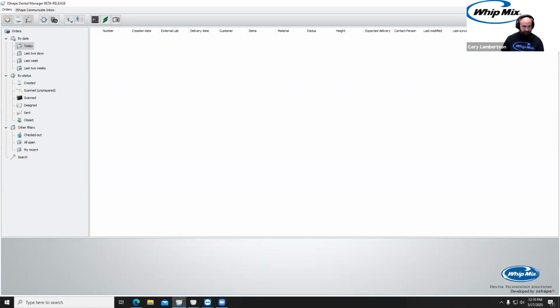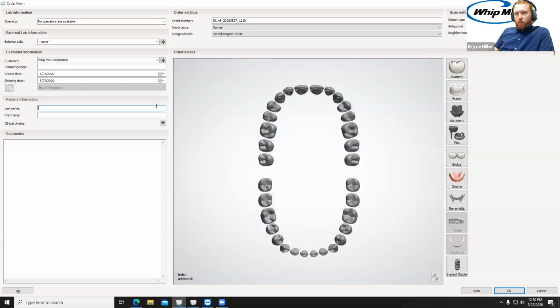Okay, cool. So we're just going to start a new order by clicking the new order button. We're just going to call this flexible webinar.